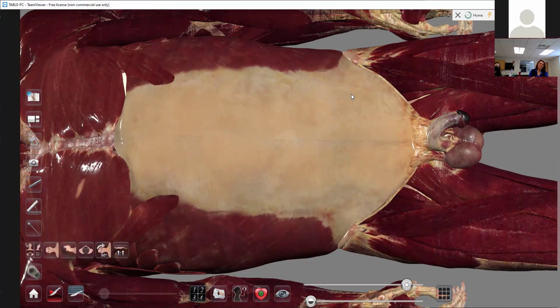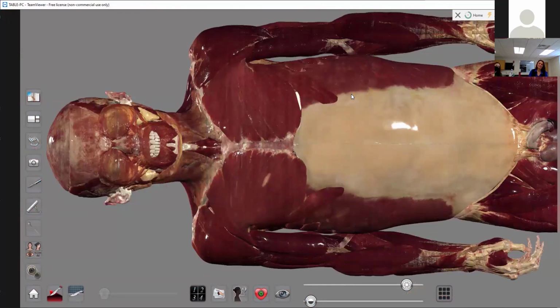A tool that is kind of like the dissection tool but is less specific, I suppose, is the removal tool. This silhouette with a question mark right here is what's called the Explore tool. The Explore tool has 3 tools within it. That'll happen sometimes on the table: you hit one button, and then once you hit that button, you get 3 more buttons. That's how the Explore tool works. This silhouette with a question mark down on the bottom opens up your Explore tool, and then it has 3 different options.